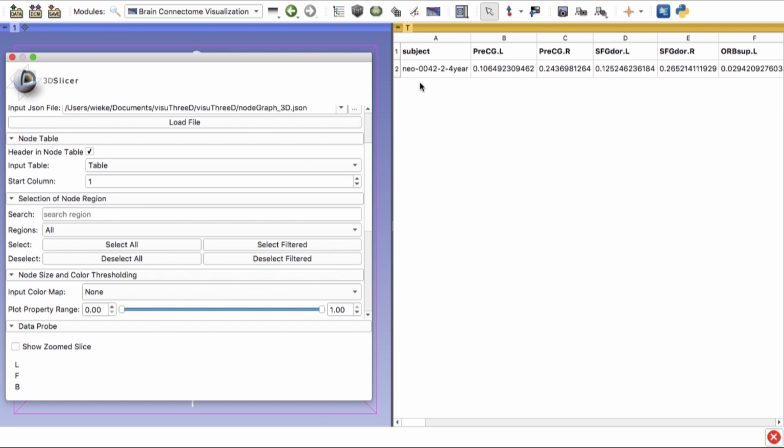I mean, that will cause a problem because it's not associated to a value. So we want to say, okay, my data starts on column 2. So 1 actually, because the first column is 0, and then B is column 1. So 0, 1, 2, 3, and so on.